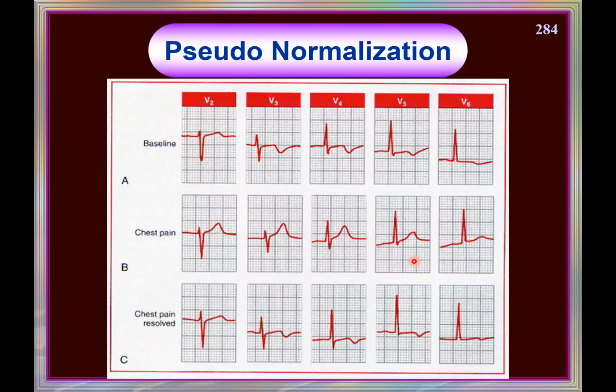There is what is called pseudo-normalization. This also you have to understand. What is pseudo-normalization? This is the baseline. So baseline ECG, ST segments are here.